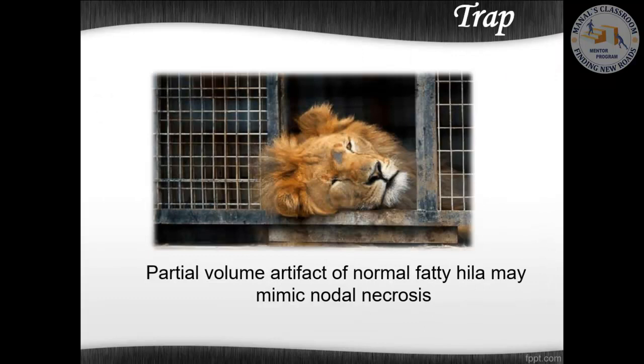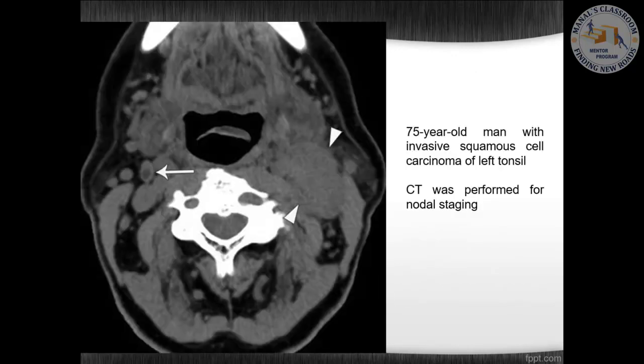What's the trap about necrosis in the lymph node? Partial volume artifact of normal fatty hilum may mimic nodal necrosis. Here we can see a 75-year-old man with invasive squamous carcinoma of the left tonsil. CT was performed for nodal staging.